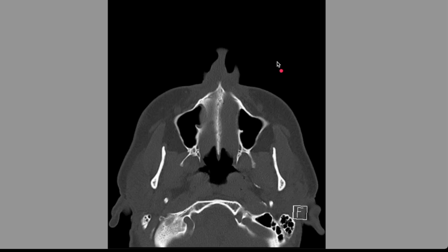The posterior wall, the deepest wall of this outline, is the pharyngeal tonsils, aka the adenoids, whenever they're enlarged or infected. Here I have a screenshot of an axial slice where the torus tubarius and the openings of the pharyngotympanic tubes are much clearer compared to the last image. So once again, this is looking at the nasopharynx in this area. And these indentations are the openings to the eustachian tubes, the pharyngotympanic tubes, whereas the posterior bulging of the mucosa is the torus tubarius, and the posterior most wall are the pharyngeal tonsils, but whenever they're large or inflamed, you can call them the adenoids.